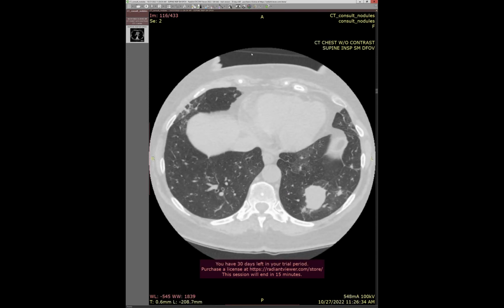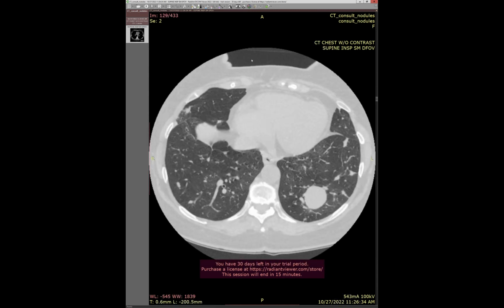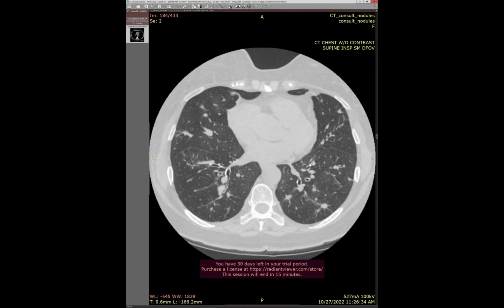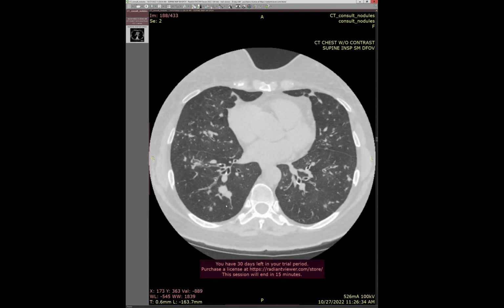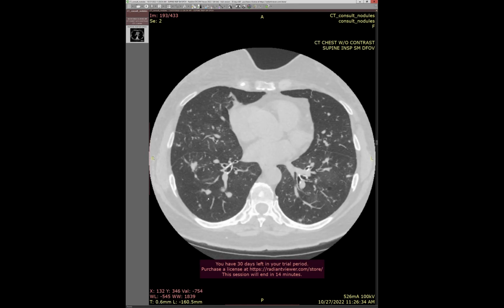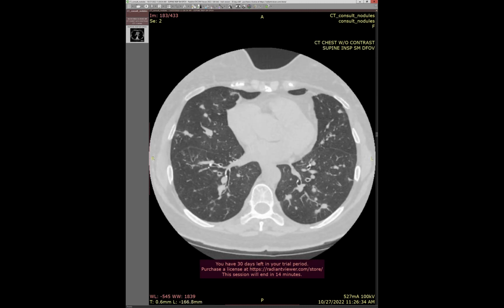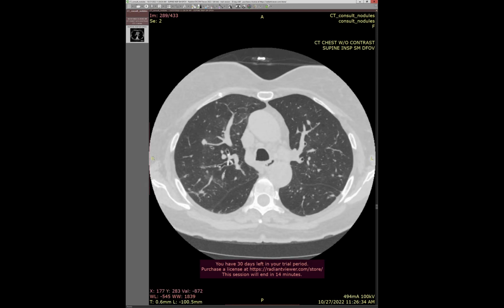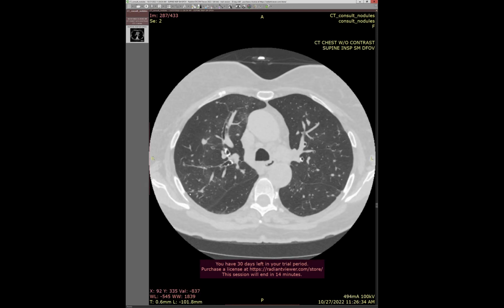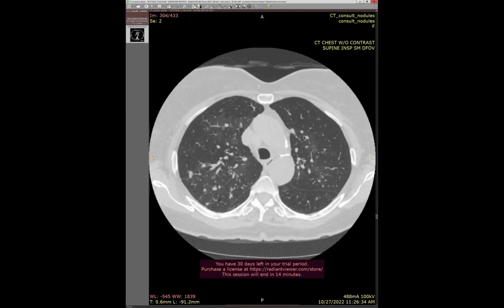And I said, it could be DIPNECH. The patient's refusing a biopsy. And I showed the people, I just didn't like it for DIPNECH. And now, it's still the best thing I have on the differential, because a lot of these nodules are very peribronchovascular. You can kind of see them going along the peribronchovascular interstitium. There are just so many. In the cases of DIPNECH I've seen, there's a few scattered nodules, but you can see here, look, there's nodularity along the peribronchovascular interstitium.